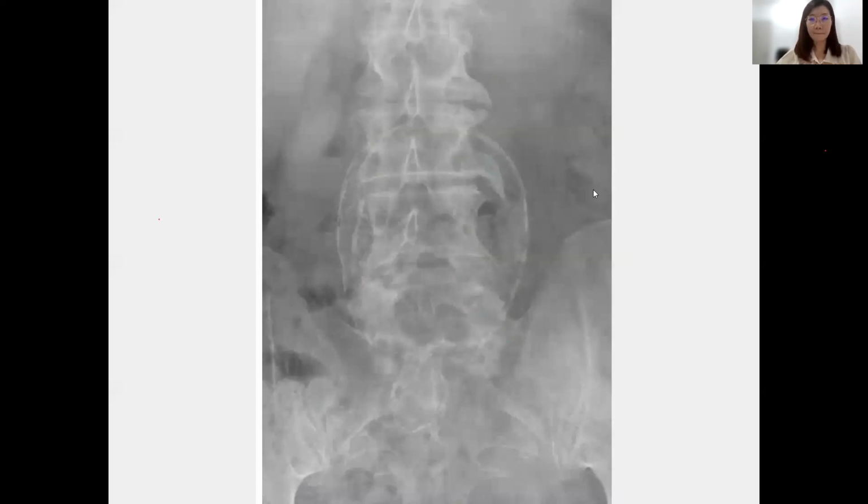Okay, what about this? Anyone? This looks like calcification. Now we are in the topic of calcification. How to differentiate bladder stone from a fibroid? Bladder stone, just like the picture just now, will normally have a smooth border. And then calcified fibroids won't occupy the center of the pelvis. They're always at the side, slightly, and more florid and lobulated.